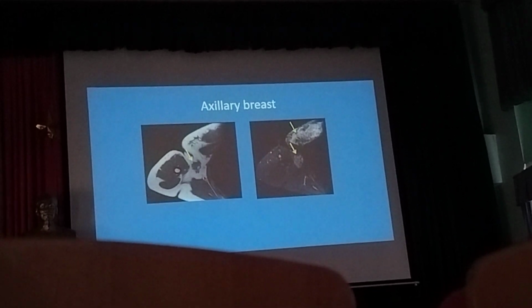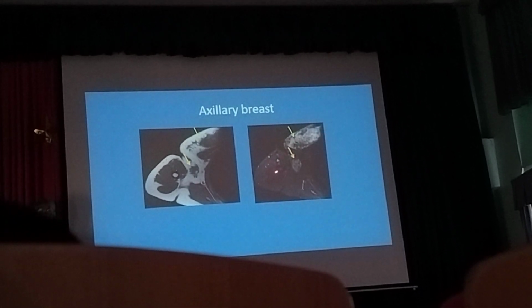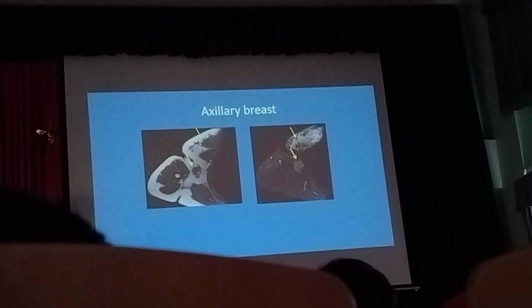And this is actually, the finding of this is similar to the breast. So this is axillary breast in the pregnant woman.